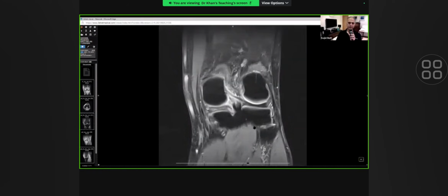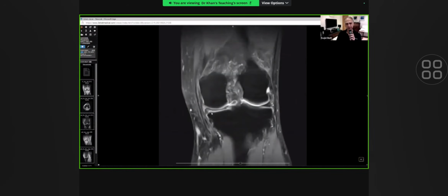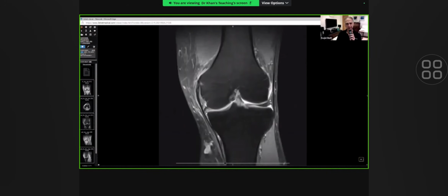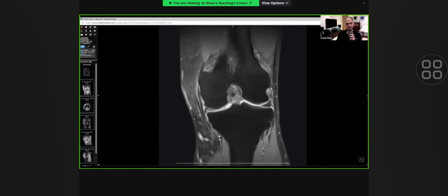And this one image is the most important image in any knee joint assessment, because that allows you to assess the posterior root of the medial meniscus, which has a tear in it. Plus the degenerative horizontal cleavage tear is communicating with the inferior meniscal surface in both the coronal and sagittal imaging. So, extensive tear of the medial meniscus.